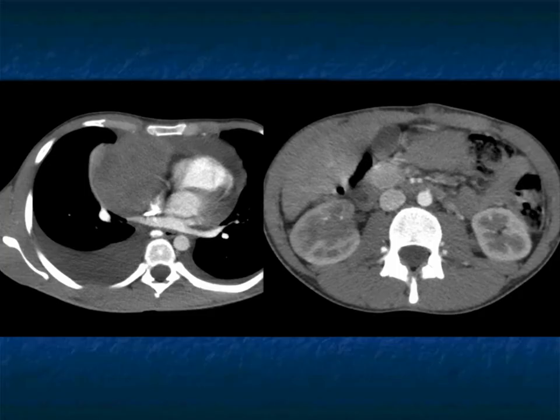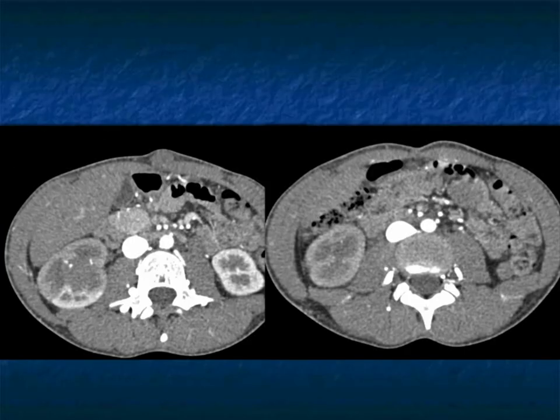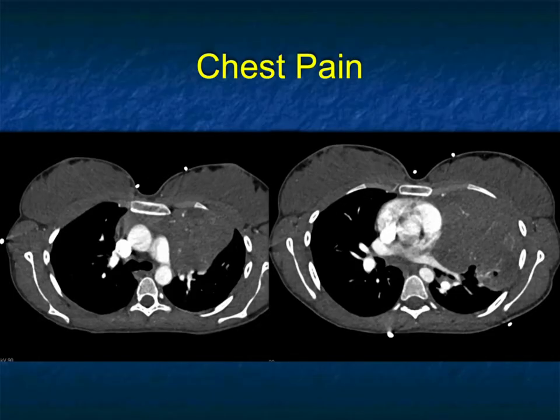And again, nicely shown here, the involvement of the right kidney with infiltration. And we talk about lymphoma having many appearances in the kidney. One of them is going to be infiltration, as was the case here. If you didn't know about lymphoma, you could have thought about an infiltrating transitional cell carcinoma, perhaps, as a likely diagnosis. The extension through the chest wall or involving the chest wall, we mentioned thymoma, but lymphoma is one of those lesions.